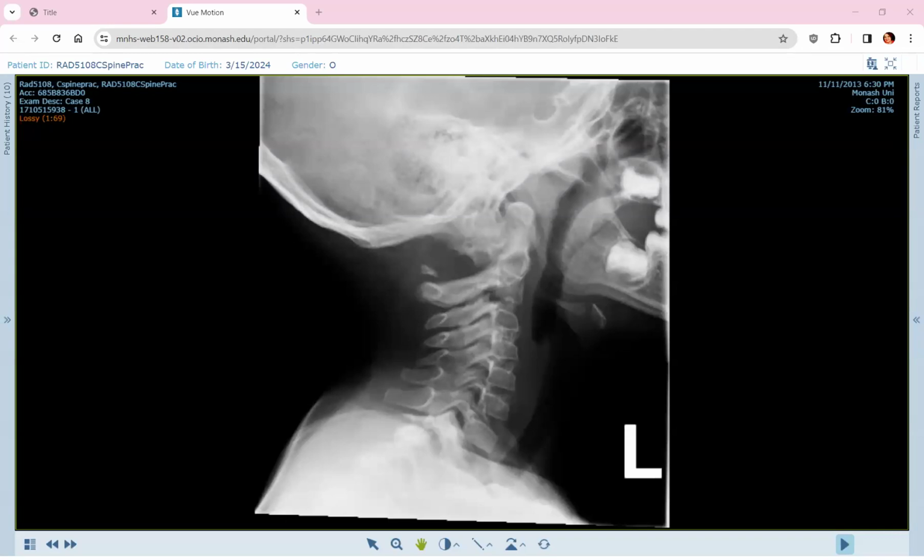This happens normally between the 3rd and 5th years of life, where there's failure of ossification of the posterior arch, so this is a quite rare congenital condition. Patients don't always know about it, but they are at risk if there's any injury, and it doesn't have to be major, as it could lead to quite significant instability in that area. So basically we have hypoplasia of the posterior arch of C1.